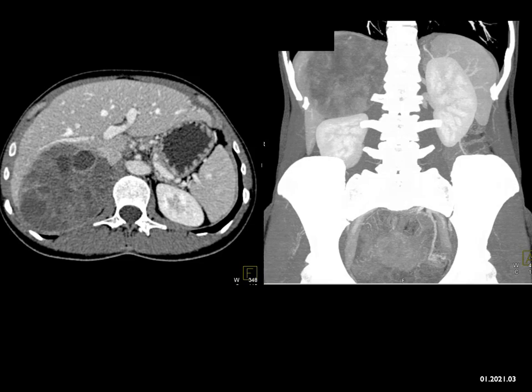And so you got to think to yourself, what is this? Well, this is a large adrenal mass. It's worrisome because of solid and cystic. Now, most pheos are hypervascular, but it could be a pheo. Metastatic melanoma, usually soft tissue masses, but it could be, they're large. And a primary adrenal carcinoma is a good possibility, just the way the lesion looks.